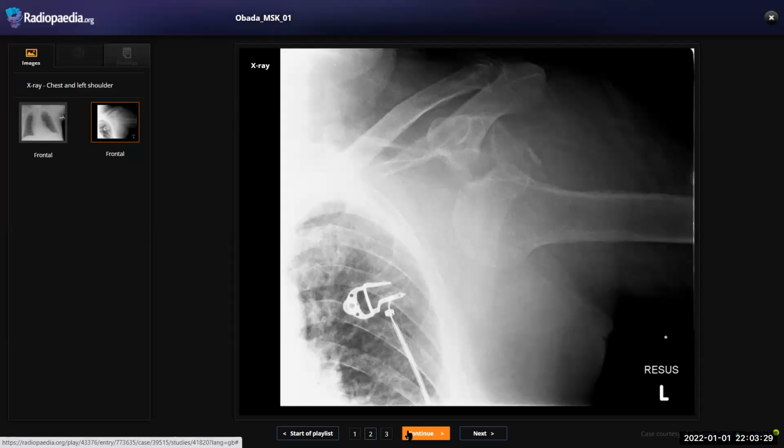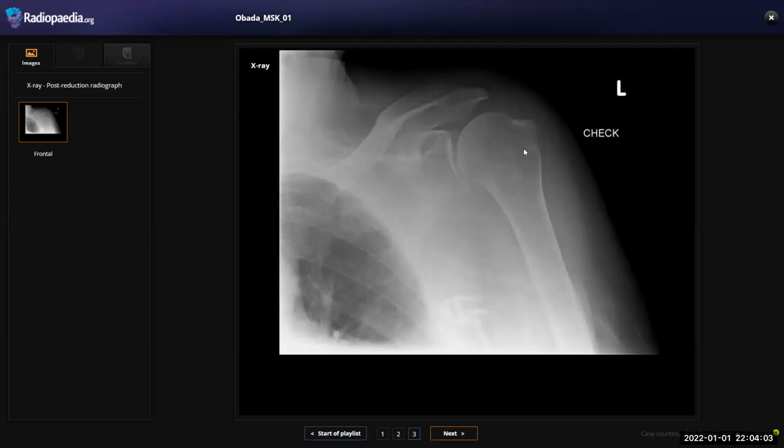this is rare, but you have to know inferior dislocation of the shoulder. It's important because it's very common to cause neurologic and vascular compromise. Neurologic by axillary nerve and brachial plexus and either radial nerve, and vascular axillary artery injuries. As you said, we should do MRI after immediate reduction. We should not delay reduction. And it's associated with greater tuberosity fracture, and it's better to evaluate Hill-Sachs and the Bankart and glenoid, especially the inferior capsule, on the MRI. It's very well done.